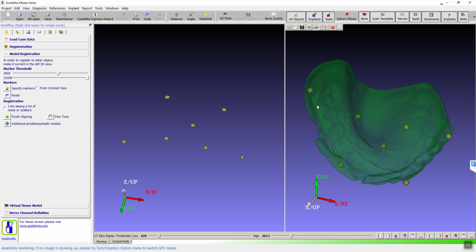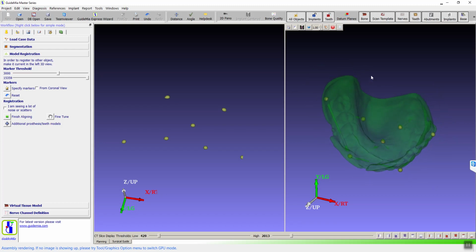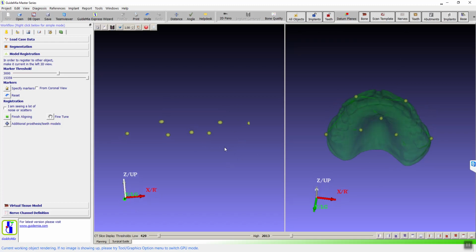It's like we actually make a slot between the two markers. I don't know how the radiographic guide is made, but the shape, it's okay. I'm just curious. So let's look at the situation we have now.